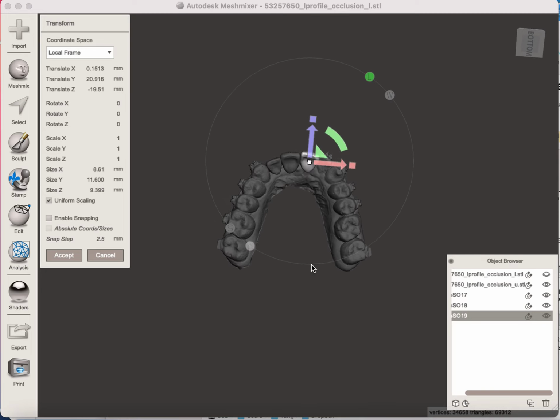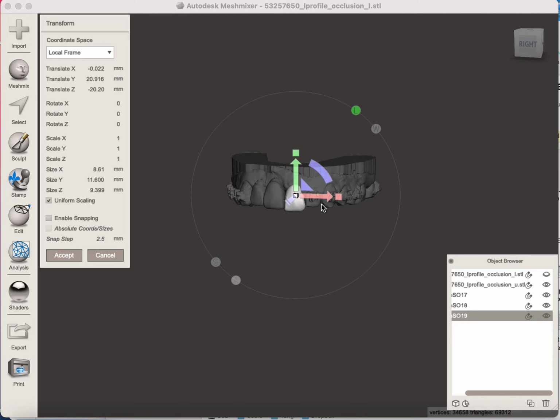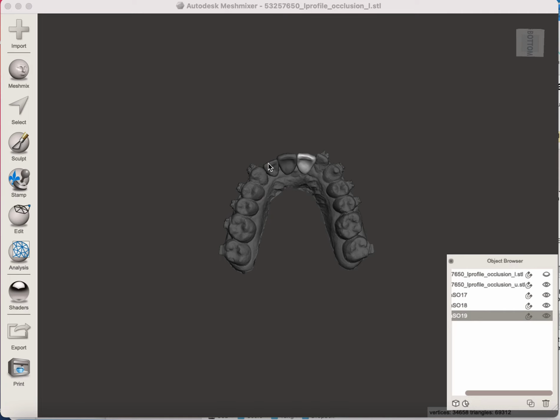Now if you have access to ULab or the new version of Archform, that does this automatically for you. And all you have to do is kind of change the shape of the teeth and the size. Okay? I actually prefer the Christian Bren's shape and size of the teeth, but there's more work to manipulate and move it to the ridge.